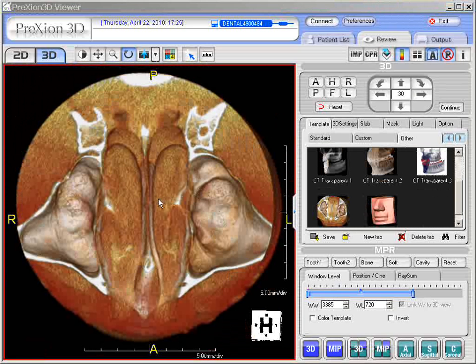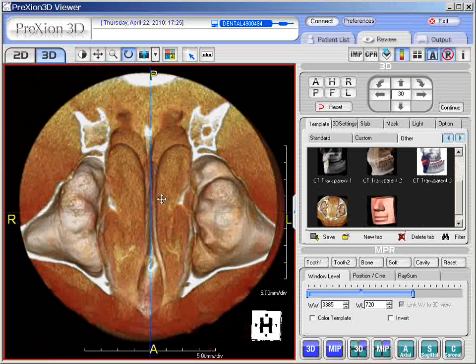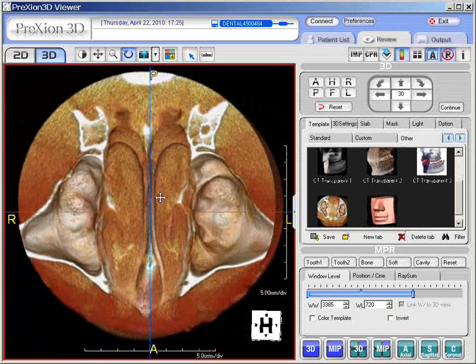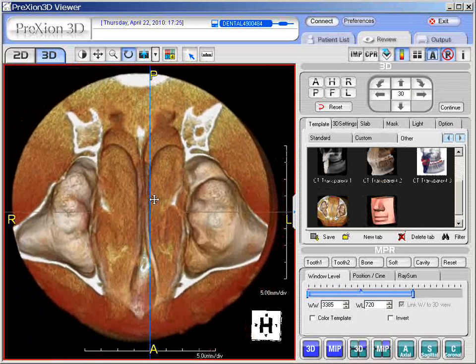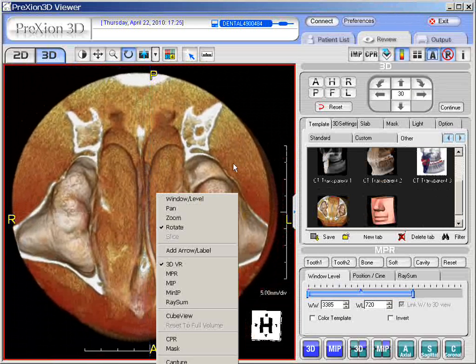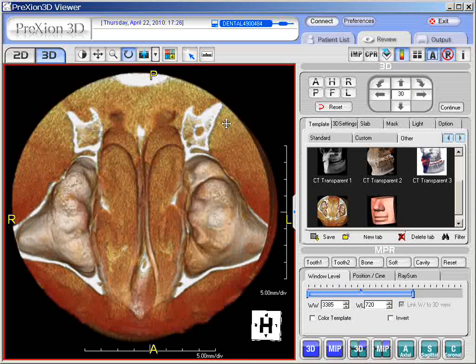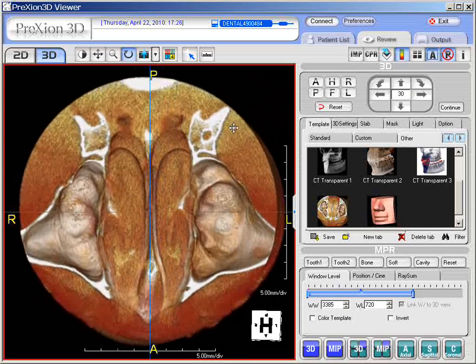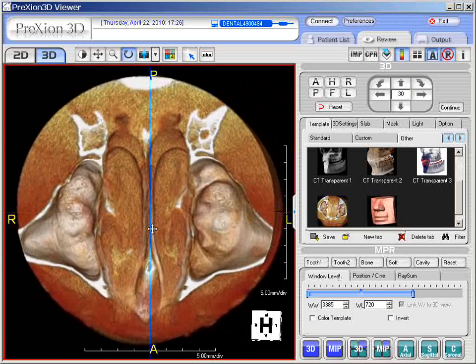Now for recentering, one can press the right click on the mouse. Notice the white caliper. When the mouse is moved, the blue crosshairs come into play. Okay, so you can recenter with the right click. The right click also serves as a pop-up menu. If one wishes not to use the pop-up menu, just hold the right click down, wait for the white caliper, and then move and recenter, re-pan your position. Again, the pan is performed with the right click of the mouse.